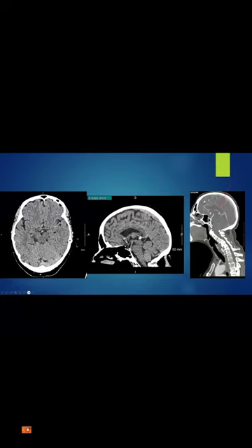So I did the sagittal reformat, and there's a mass-like thing in the middle of nowhere. It's not part of the brain, or not part of anything. It's just by itself. So based on this, I suggested there is probably an anterior communicating artery aneurysm, and they did the angiogram, and there's this chunk of aneurysm here.